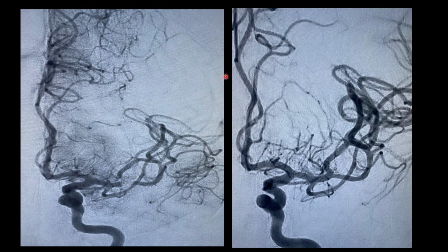There's one more thing I want you to see here. See, these areas of blackishness which we see are all the areas of perfusion which is occurring in these territories. And in the left MCA territory, this is the penumbra which is seen in the angiogram. See, the entire ACA and MCA, and even in the MCA, the inferior divisional branches are all showing good blush. But there is no blush in the area which will definitely get infarcted if this patient is allowed to be in the same position. So this is also an indirect evidence of penumbra which is present in the patient.